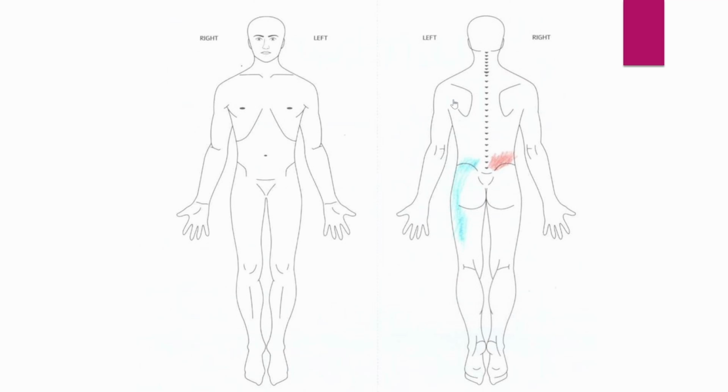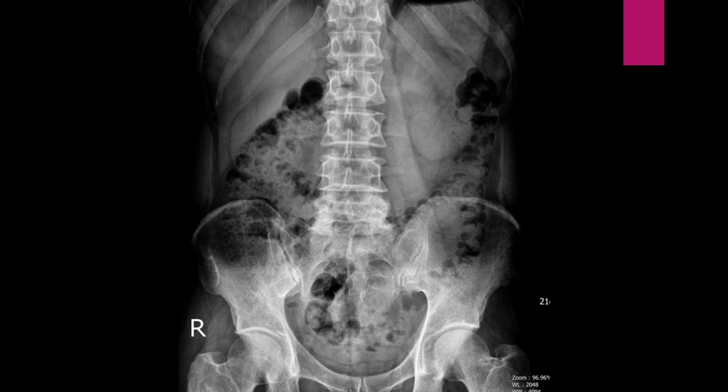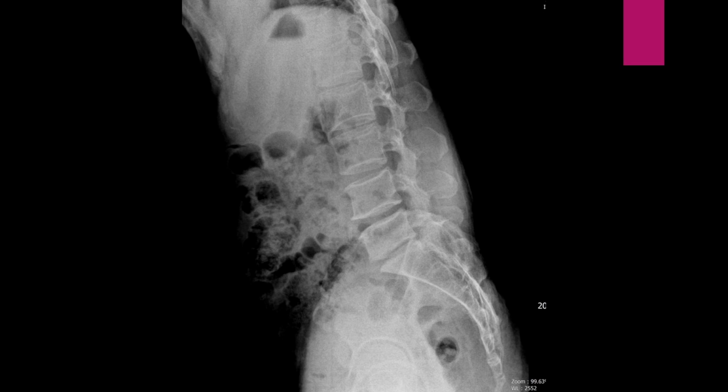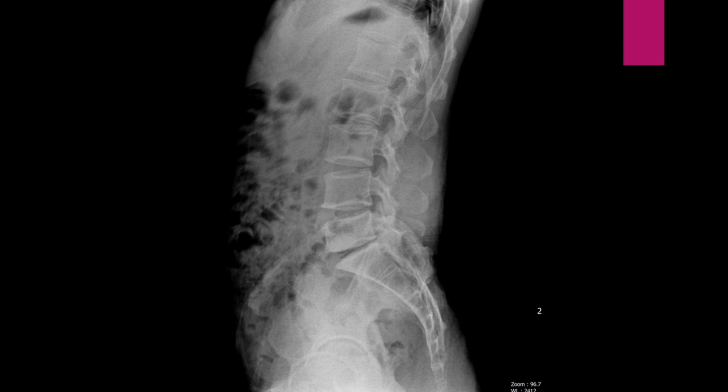His symptoms include tingling extending from his left gluteal region to the posterior thigh and tightness in his right lower back. Now, take a look at the radiographs. Analyze the alignment, looking for any irregularity in the shape of the vertebral bodies and any alterations at different levels. Evaluate the bone density for any changes in each vertebra's density. And finally, assess the cartilage spaces. Is there any narrowing or widening? Can you determine if this is an instability or stabilizing phase?